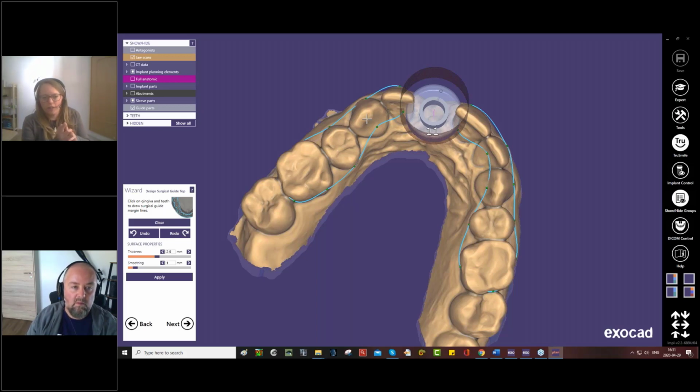Okay. You have the possibility to skip the sleeve placement during the implant planning, and if you do that, you have the sleeve placement as your first step during the guide design. And then if you only place 2 sleeves, you will create a guide with only 2 sleeves for these implants. But still, when you do the second guide, you have to start by placing the other 2 sleeves. Is this clear? Yeah, so the implant planning can be done for 4 implants. Then yes, that's exactly it. And I asked him, he said that this is answered now. Okay. Yeah, it's clear, you do the planning once.